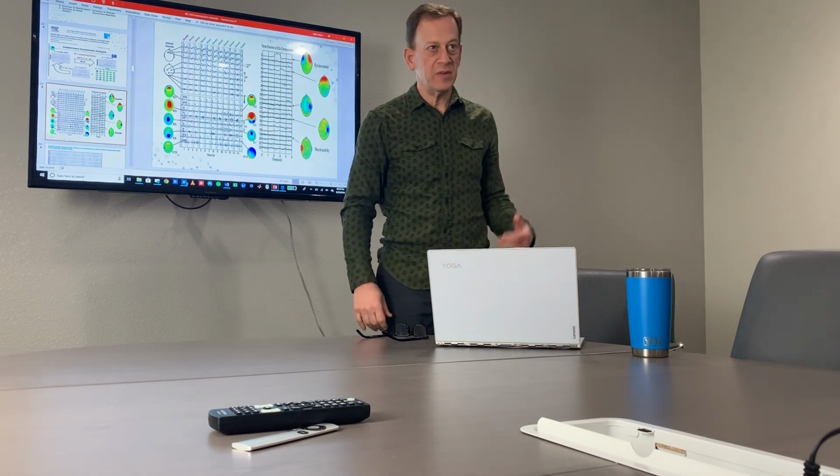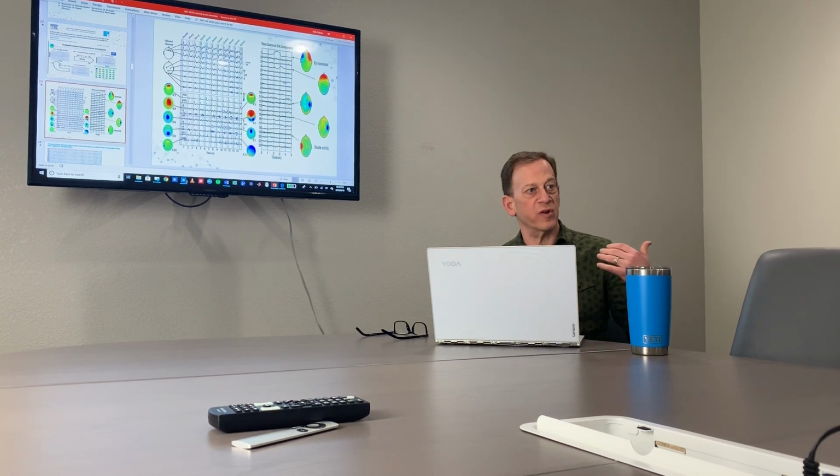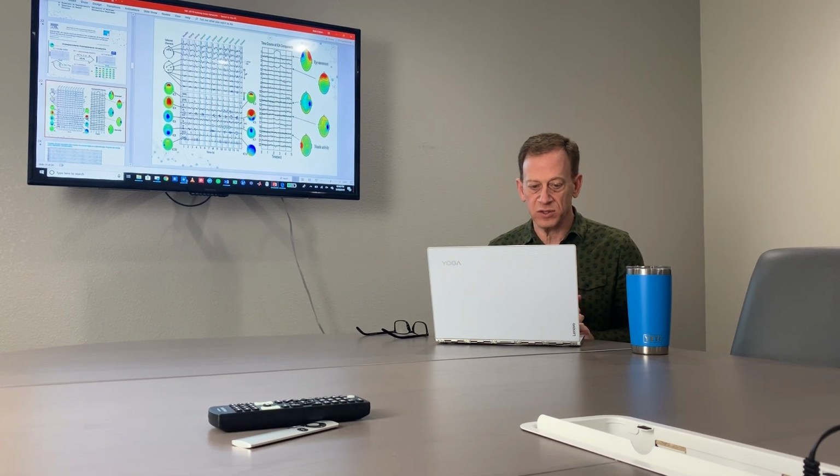So one might be theta activity, one might be alpha activity, one might be activity over the right parietal lobe or the right frontal lobe. And we can keep and isolate all of those from each other and then include them in the analysis more specifically. So it's a way for us to eliminate or reduce artifact as much as possible, and also to separate out the EEG into different components that can be analyzed uniquely.